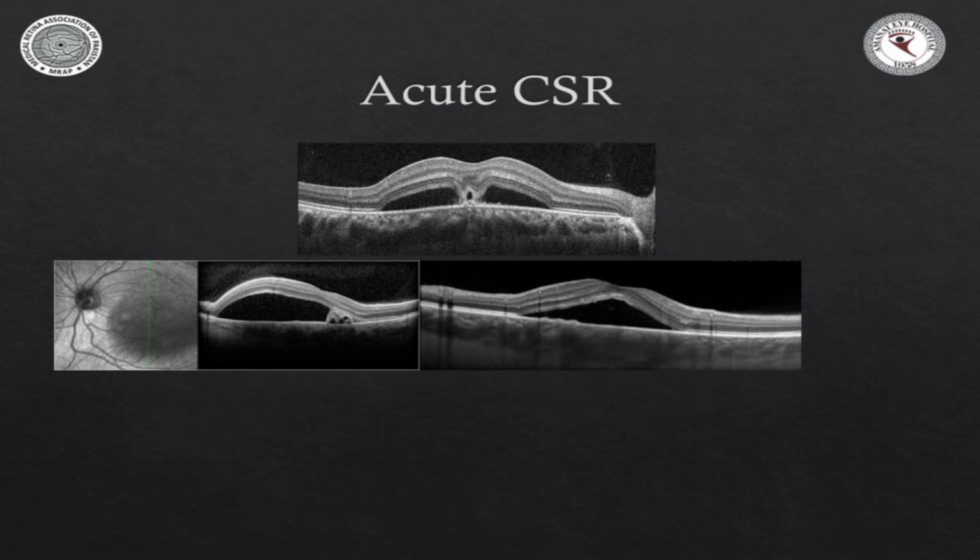Because acute CSR में fibrinous element होता है within the cavity that is being formed. So it has these adhesions that's hard to let go of in an acute CSR. So you've actually caught it very early. Best to wait in this case. So do not be alarmed by this kind of thing.